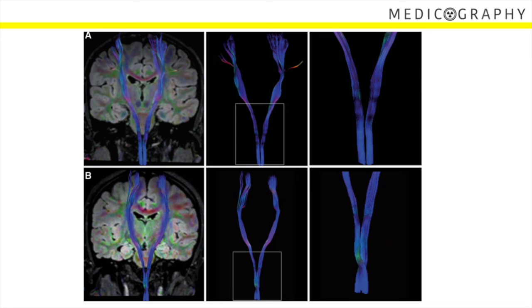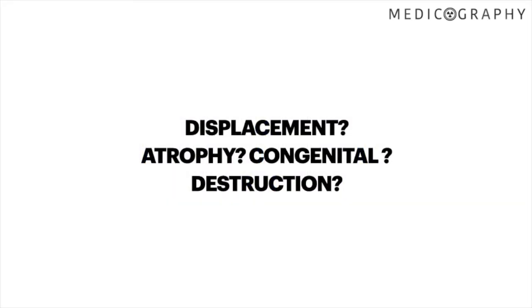If you still remember my previous slide, you can see here that there is no decussation on the A picture, on the above picture, there is no decussation of the corticospinal tract, while the B picture is the normal crossing corticospinal tract. So yeah, this is a real example from my previous illustration slide about the decussation of the corticospinal tract. What should we report?